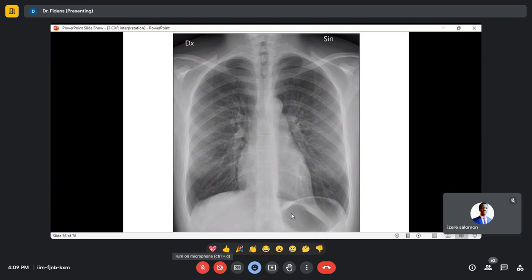And this, I told you, there's some effect on the chest radiograph. Like the hemidiaphragm on the left side was not supposed to be at the same level as the one on the right side, but now they are almost at the same level, meaning distension of the stomach, gas distension, pushing upwards the hemidiaphragm. This can even cause some pain, chest pain.